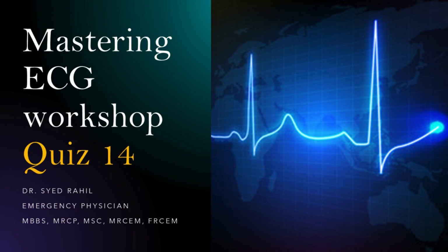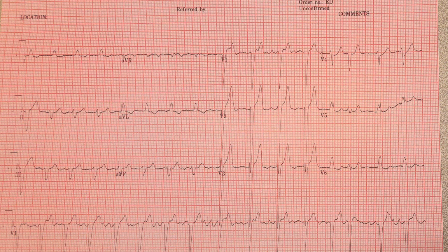This ECG belongs to a 72-year-old female patient who presented to the emergency department with a history of palpitations. She denies any history of chest pain and she is hemodynamically stable.